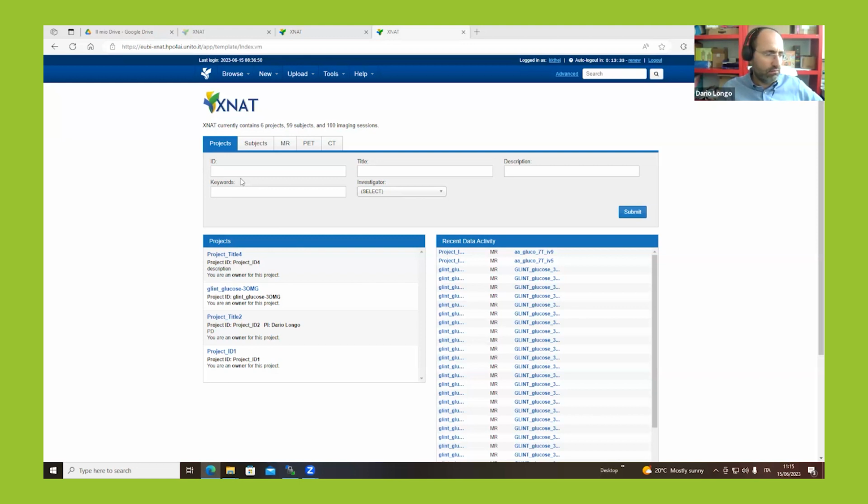And then you can look at the final results directly on the images that are stored in the XNAT platform. I think this is one of the main advantages, in particular when you have multiple people working on the same project: people who perform the acquisition, people who perform the processing, and others who do other work on the images.